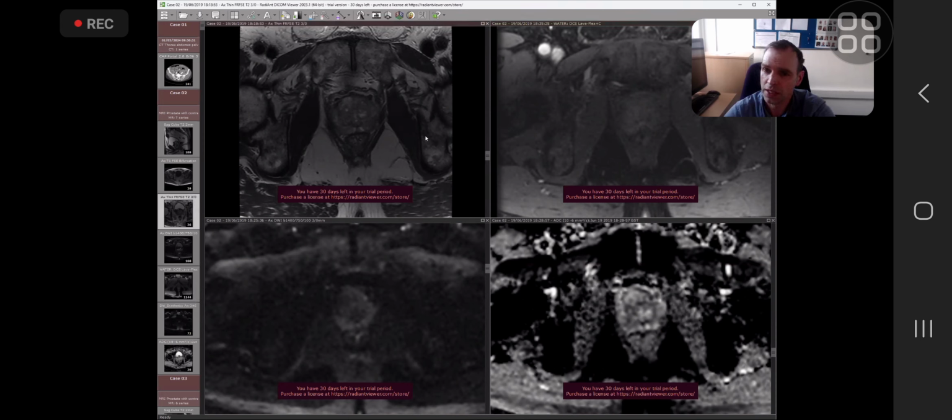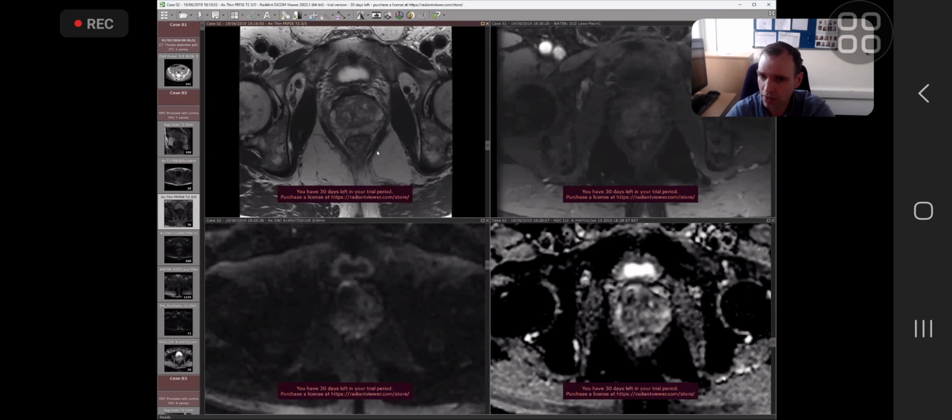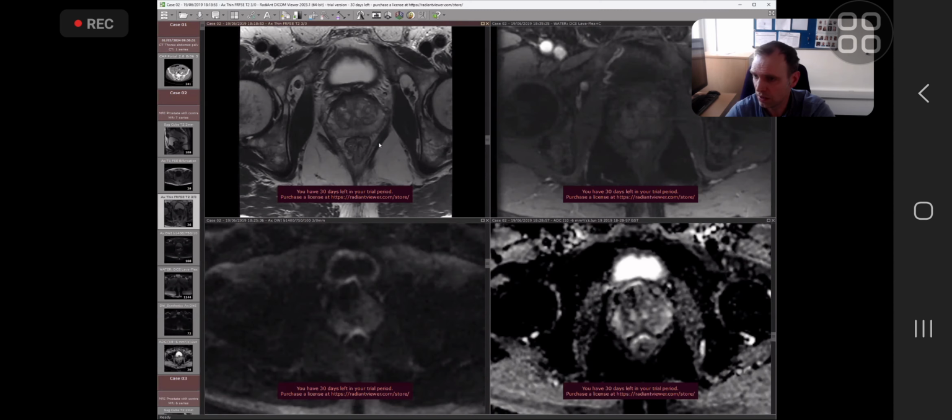Then I would move on to the T2, and as you described, look at the T2 in isolation. Then after that, use the diffusion weighted imaging, and as you implied, not everyone does DCE, and then you would look at that third. So it's a stepwise approach of looking at the T1 initially, the T2 diagnostically, then adding in the DWI alongside it, then adding in the DCE after that.